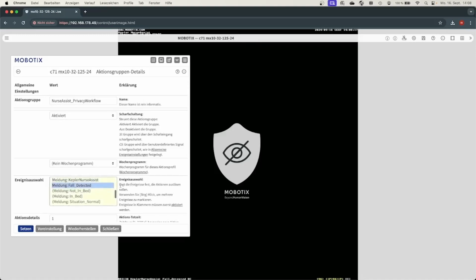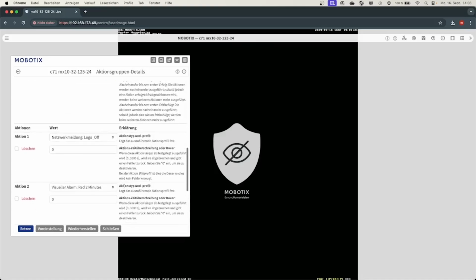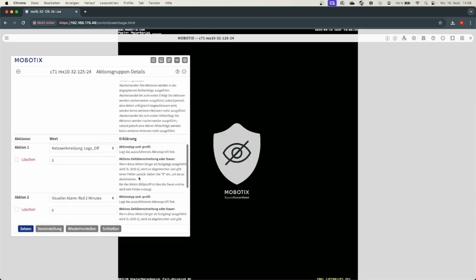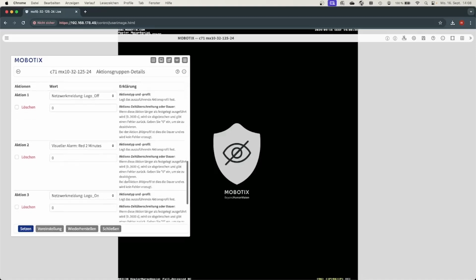If you want an action only when a fall is detected, then you need to select the fall detected event only. And then you see the actions. The first action is to switch off the logo to see the live image. This should then be a visual alarm for 2 minutes. And after that time, the privacy masking, the logo on, should be enabled again.